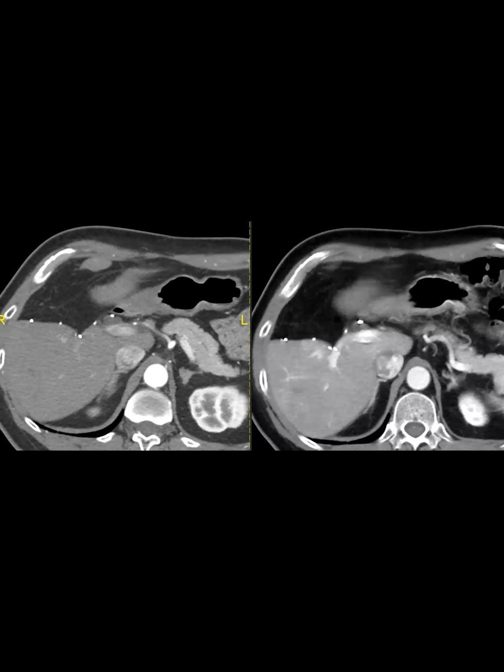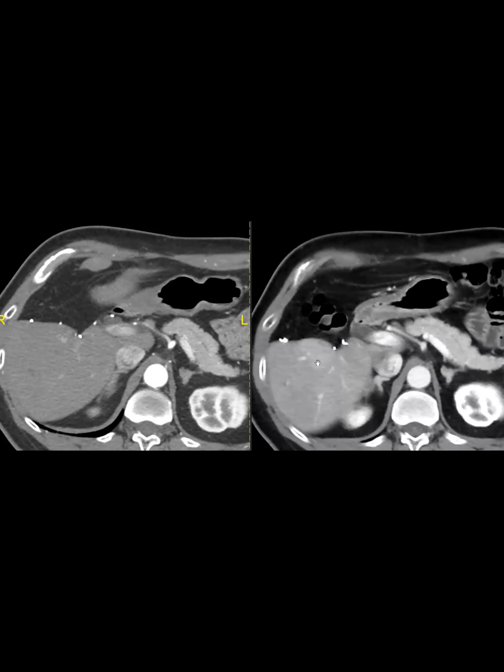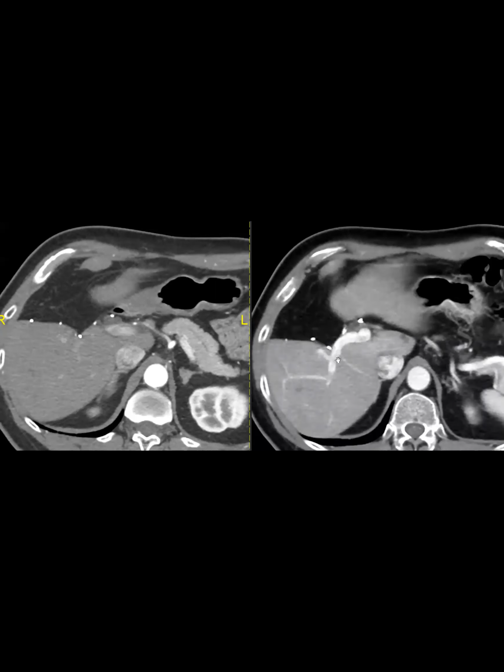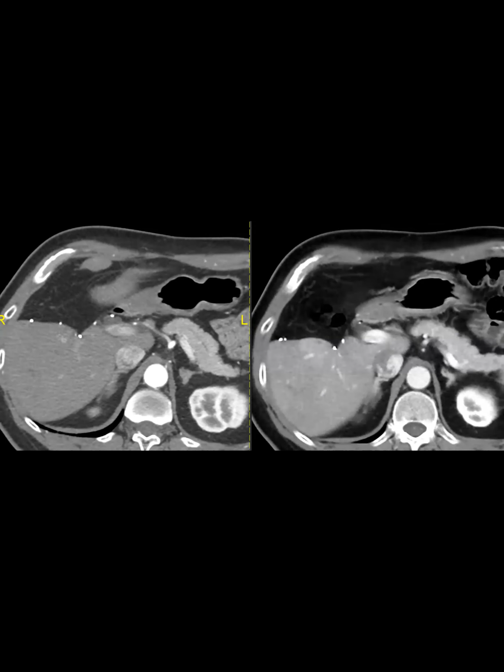Wait, sorry, just to clarify, corona, you mean for the actual lesion, right? Not the geographic subcapsular perfusional changes? So this thing is corona, right? Because it's around the lesion. Oh, I thought the lesion was tiny. Yeah, the lesion is tiny, and she's calling the perfusional thing the corona. I thought corona was like a rim around the lesion, not necessarily like a big geographic perfusional thing.